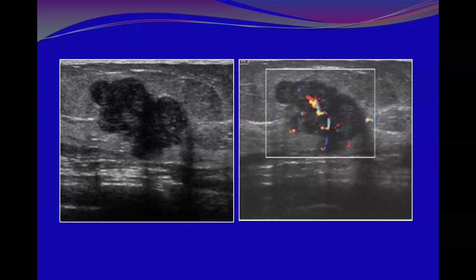Okay, what about this lesion? What do you think about these lesions? How are you going to label the shape or describe the shape of this lesion? Any suggestion? I would describe it as roughly oval. It has roughly more than three. Okay, this is your suggestion. Do you agree with her or disagree?